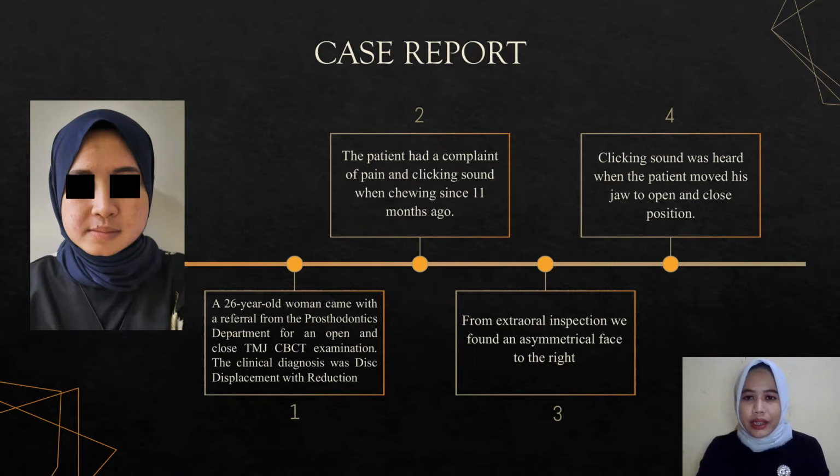The clinical diagnosis was disc displacement with reduction. The patient had a complaint of pain and clicking sound when chewing since 11 months ago, and from extraoral inspection we found an asymmetrical face to the right, and there is also clicking sound when the patient moves his jaw to open and close position.